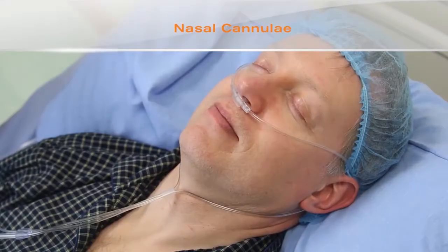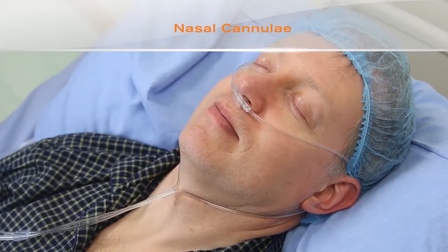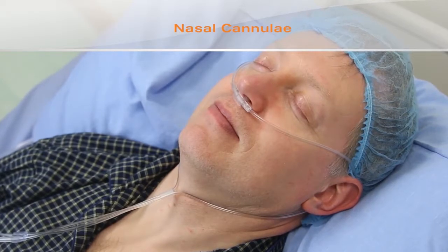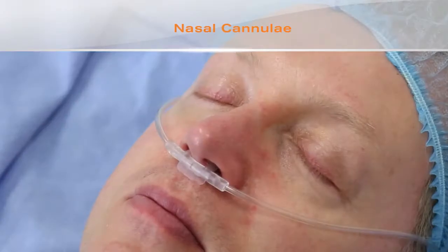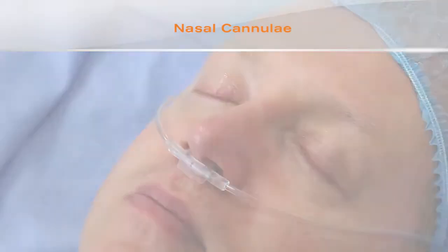Nasal cannula are also available which allow sampling of exhaled carbon dioxide in non-intubated patients, and the Intersurgical devices with this feature are called Sentry nasal cannula. These devices are suitable for patients undergoing conscious sedation where respiratory depression needs to be monitored.